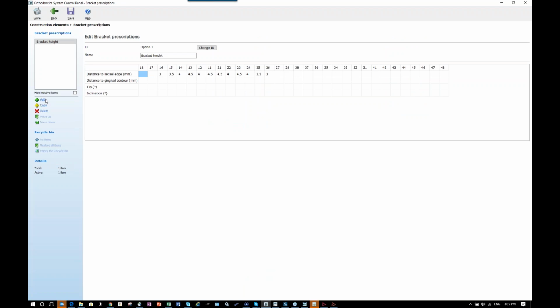All right. So if I'm using some preferences that I use all the time, then I can type them in right here. For example, this one makes the heights all on the same level, the central, lateral, and the cuspid as well. I put all this information right here in millimeters. So later on, if I want to use this preference, I can just bring it in and it forces the setup to follow this prescription that I did. Okay.